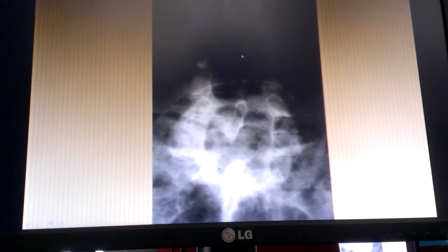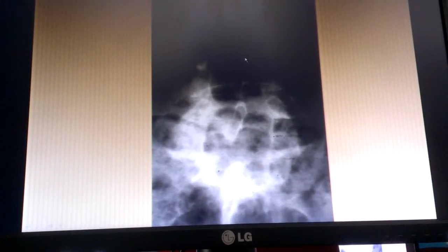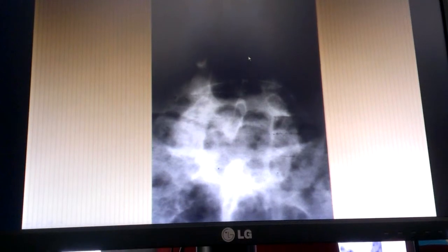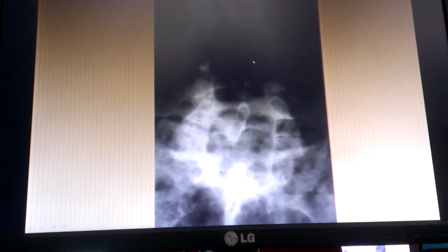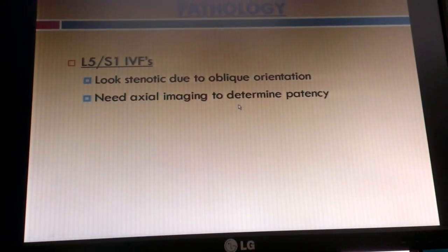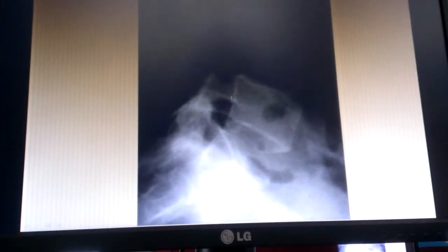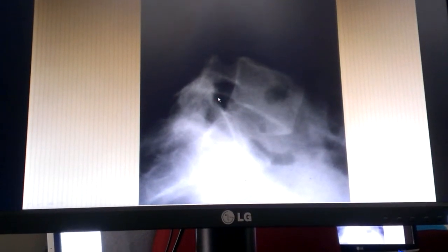When they get a little too close, then we say they've got kissing spinous processes, right? It's also, don't worry about that, Baastrup's disease. And usually then they become sclerotic where they kind of butt up against each other, and they become even bigger and squarer than otherwise.